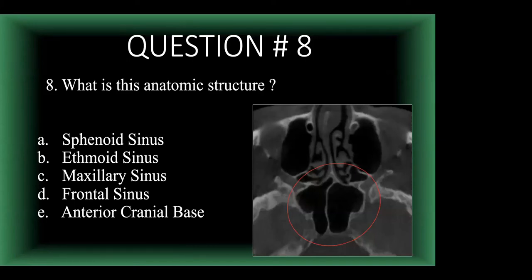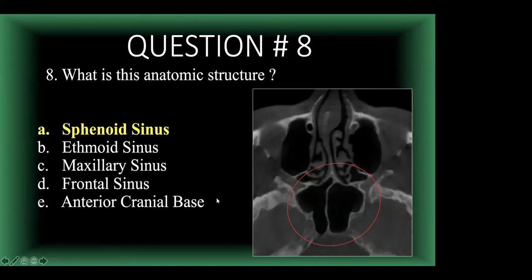And our results are, Robert. Very good. Most of you picked sphenoid sinus. So this is called the sphenoid sinus. The sphenoid sinus is a bilateral, one of the 4 bilateral paranasal sinuses. This is actually under the cranial base. This is a common area to have a sinusitis where it will exhibit headaches. So patients with chronic headaches can sometimes have a chronic sinusitis in this area.